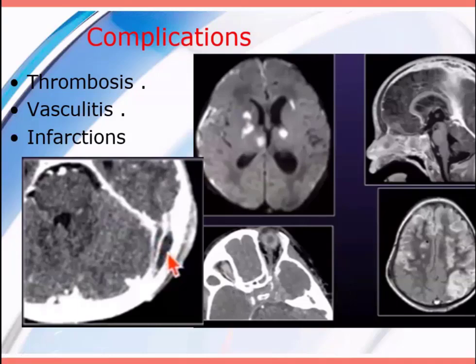Because the small vessels penetrating into the area of the basal ganglia and the thalami are penetrating arteries. These arteries may have deposition of the infectious material and vasculopathy and may be plugged. So this may lead to acute infarctions. Here you can see in diffusion, there are acute infarctions in the basal ganglia. So usually this is the area where the infarctions occur.